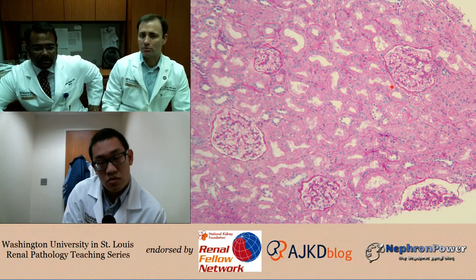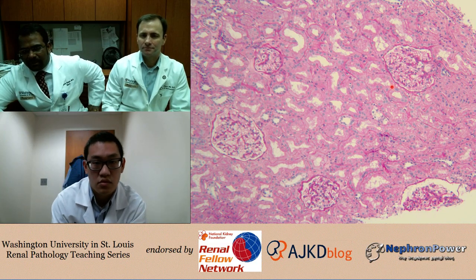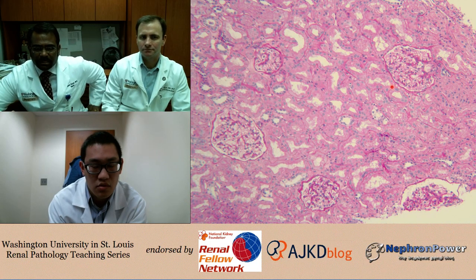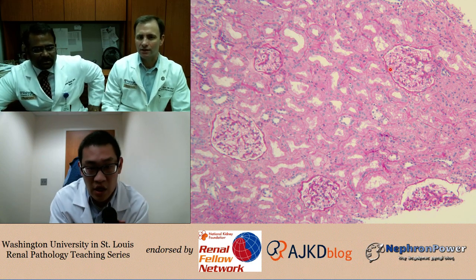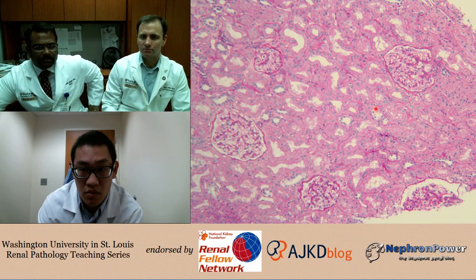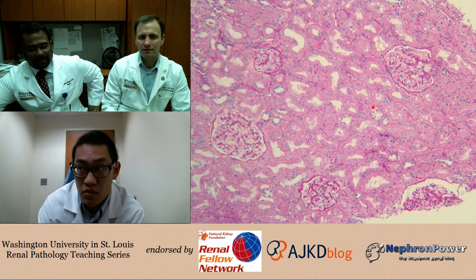Now, what about membranous? You had that in your differential. So membranous, I'm going to be looking at a pattern where the basement membranes are thickened. Just comparing the tubular basement membrane to our glomerulus, we'll want to do that more on higher power. I'll give you some higher power images. We'll get into that. And then what key diagnostic feature would you be looking at, particularly on the silver stain for membranous? For membranous, of course, we'll be looking at the spikes, if possible, on the silver stain.